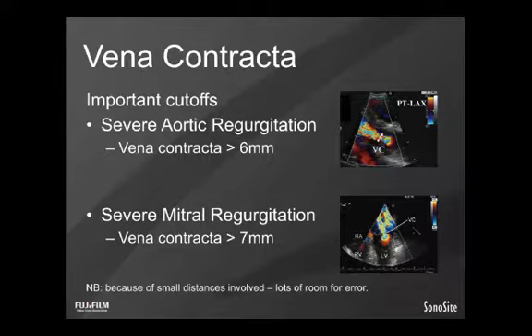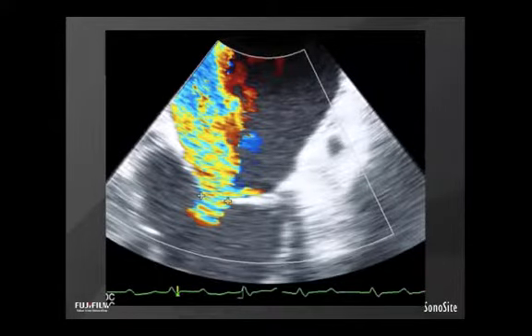But important to know about and understand, as this would represent the most logical and easiest application of a valve severity stratifying technique, the easiest one after color Doppler. And so here would be a great example of a TE image from the mid-esophageal four-chamber view zoomed in on the mitral valve. And we can see here this mitral valve lesion, very clearly the narrowest region of the jet at the valve orifice is measured.